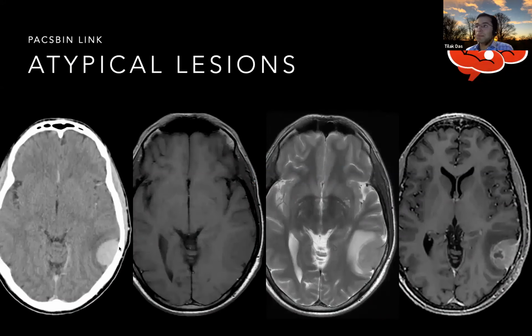So in this one, maybe some bone erosion, but actually on the CT wasn't so clear. And if you look at the cortex here on the T2, it looks fairly intact. And yes, absolutely, what you can see is dural displacement, and that is unusual. Here you can see the dark line, hypointense on T2, of dura, and also on the post-contrast scan, sort of being lifted off the surface of the skull, of the calvarium, and that is the dural displacement sign.